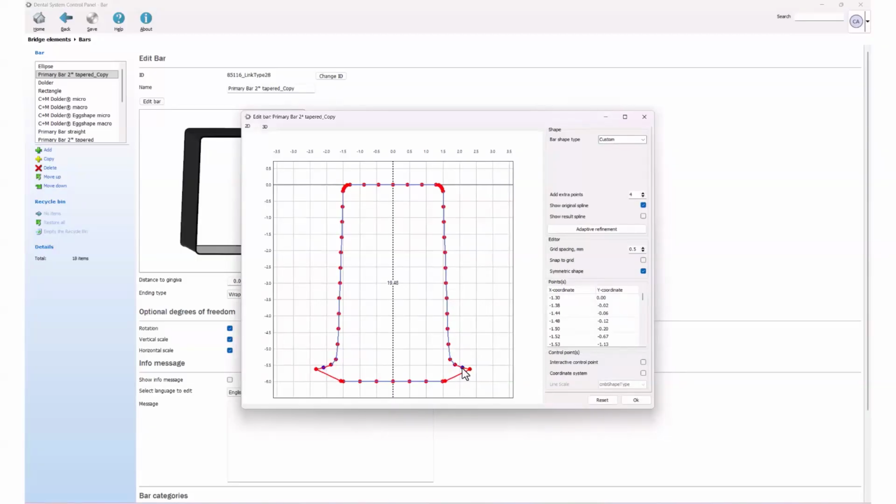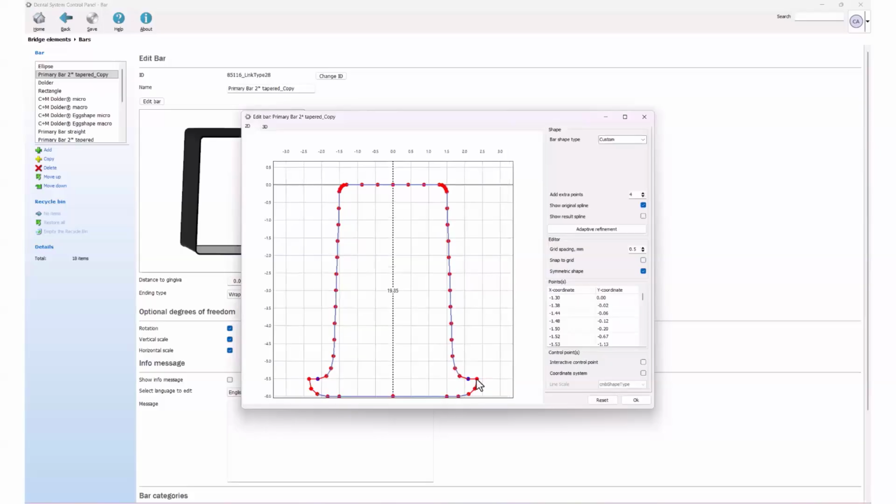with those reference points. I also clicked off snap to grid, so I have a full freeform of movement of those points. And that's what I'm referring to as one of the most frequently asked questions. How to modify the shape of the bar. How can I get the shape of the bar with a slight chamfer? So that is something that I did in basically 5 minutes.